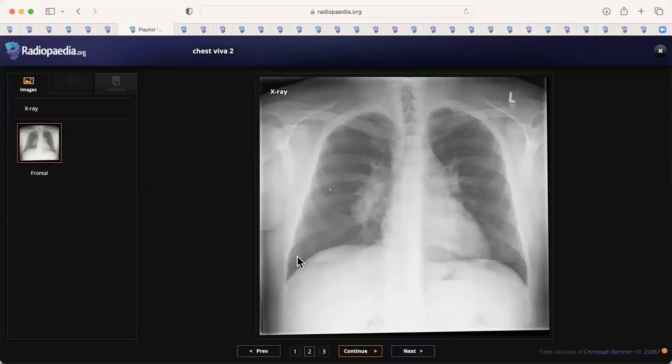So with these findings, an adult male patient with bilateral hilar lymphadenopathy and aortopulmonary lymphadenopathy, I'll think of sarcoidosis as the first possibility, probably stage 1, without parenchymal involvement. The other differentials would be tuberculosis, but usually it is asymmetric, and malignancy is very unlikely because it will cause larger masses, which will be a bit more defined, with further nodules in the rest of the lungs or in the bones.